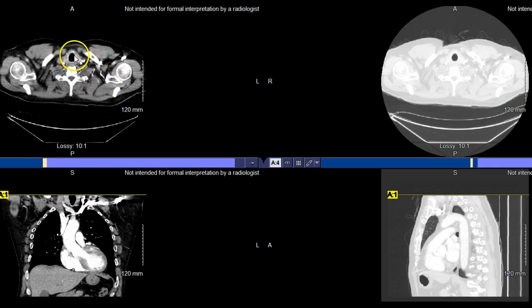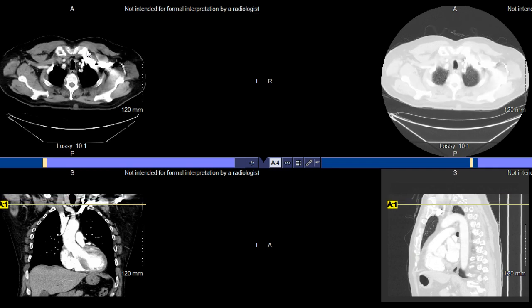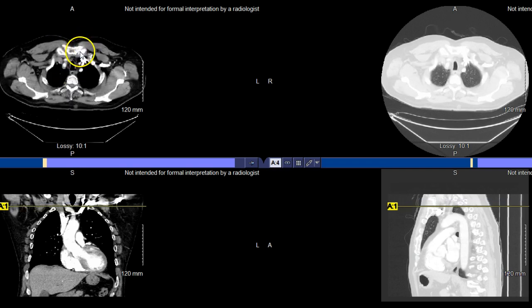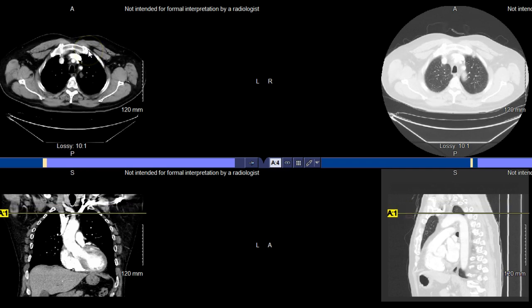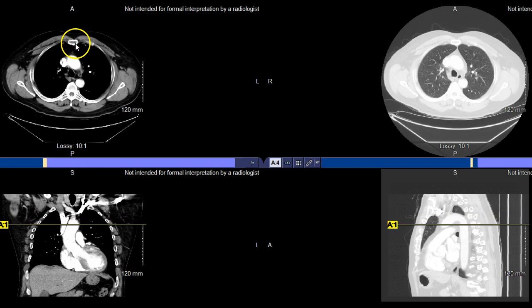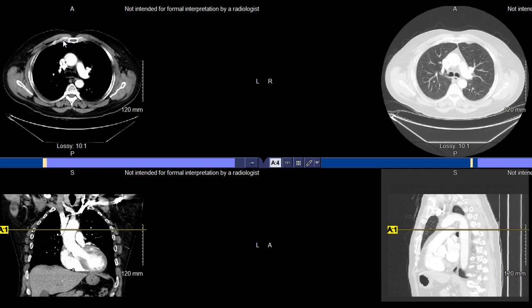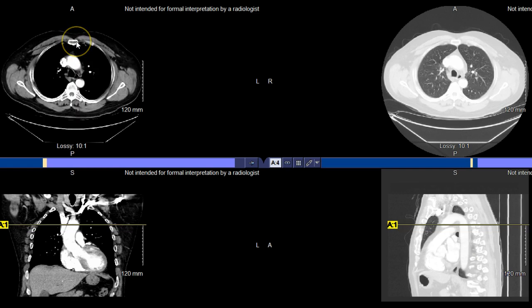Subsequently, on the anterior side of the data set, you can see the clavicles. As we go down, you can watch the clavicles and see how they articulate with the sternum. You can see that articulation point here at the SC joints, the sternoclavicular joints. Then you can start to see some of those articulations on the anterior aspect with the ribs. Here's the sternum, and we're following the sternum down. You can see those articulation points with the costal cartilage associated with those ribs on the anterior side.